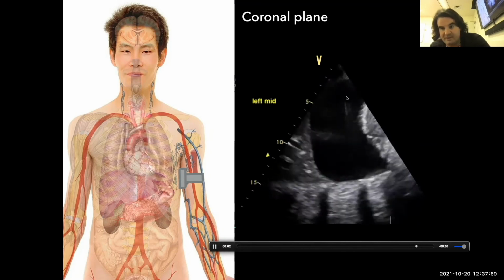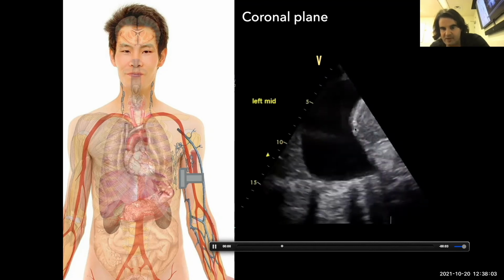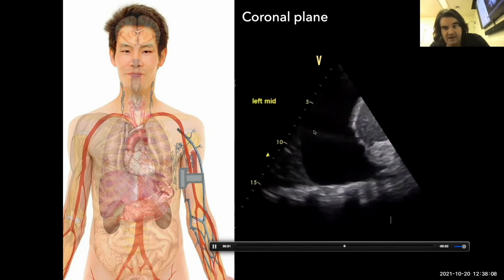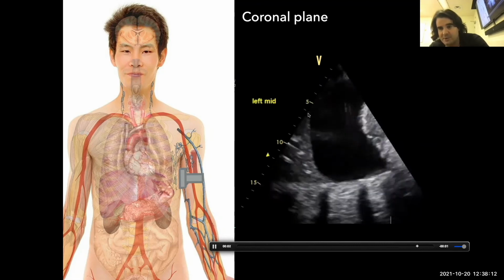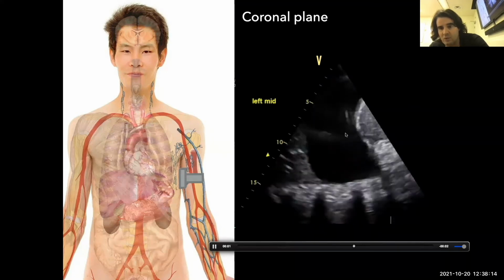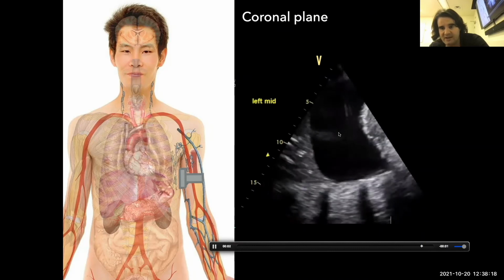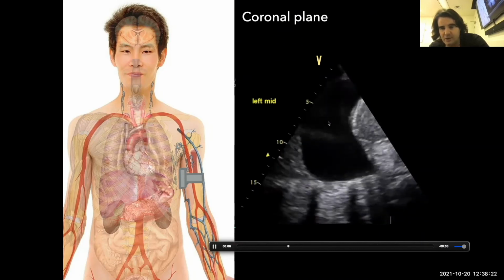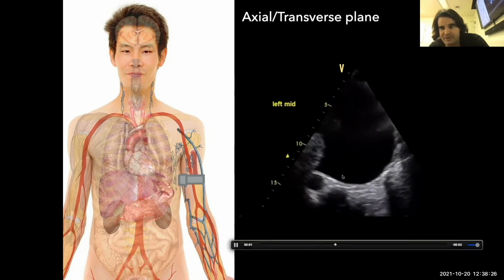If they're sitting upright, this is a great way to evaluate the size of an effusion. Each centimeter, for example, in this space would correspond to roughly 200 mLs. But again, to highlight, this is best done in a patient who is either partially recumbent or mostly upright, because of course the fluid shifts in the thorax, and it's hard to assess the true volume in the chest without a three-dimensional look.